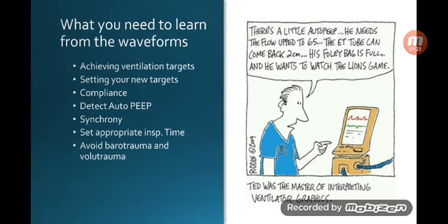But what I want you to get out of the ventilation waveforms is at least to understand how to set your targets according to what you're achieving and what's happening with the ventilation. Try to get a grip of the compliance, detect if there's any autopeep, and if the patient is synchronized. Most importantly, know how to set your appropriate inspiratory time and avoid barotrauma and volutrauma to your patients.